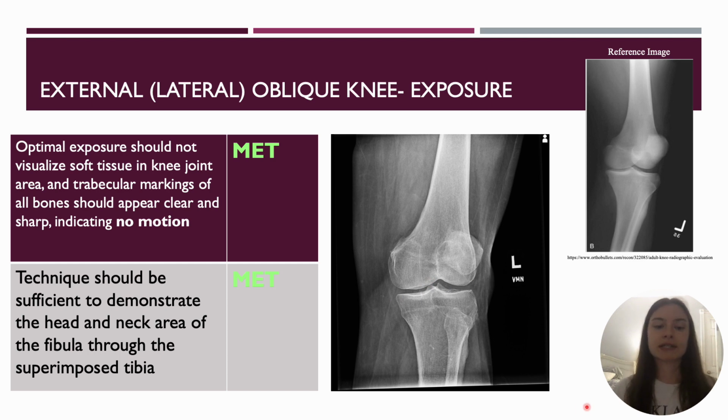And the next criteria is technique should be sufficient to demonstrate the head and neck area of the fibula through the superimposed tibia. Once again, I said met because you can visualize that fibula really well through that tibia.